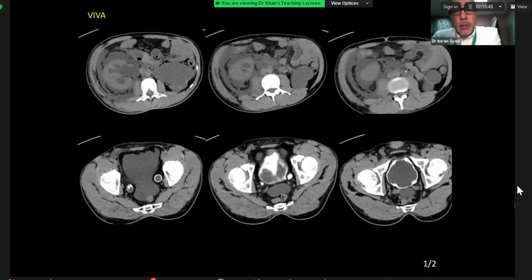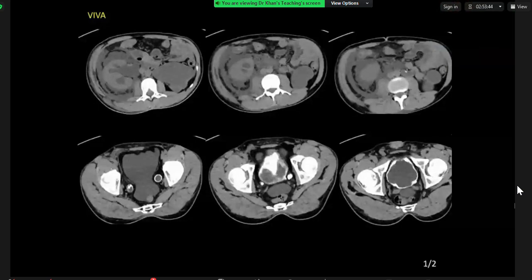And your diagnosis ultimately is what? Sorry. So the condition in the bladder, I think it's most likely to represent schistosomiasis again, or it may also represent TB given the calcification within the ureters, with an acutely obstructed right kidney, which may have ruptured.